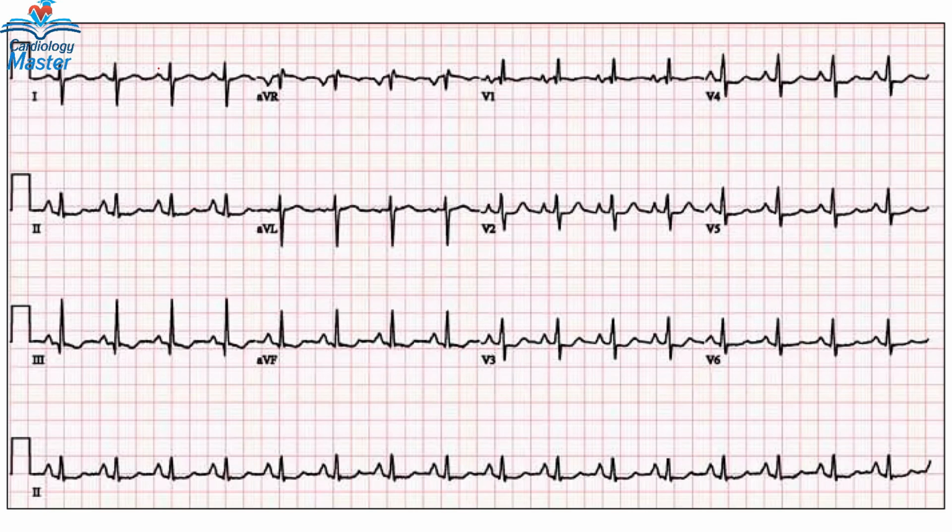A sinus rhythm means arising from the sinus node, with positive P waves in leads 1, 2, and AVF. It is negative in AVR. Each P wave is followed by a QRS complex in all leads, and the PR interval is also constant in all leads and all PQRS complexes. This is the definition of the sinus rhythm.